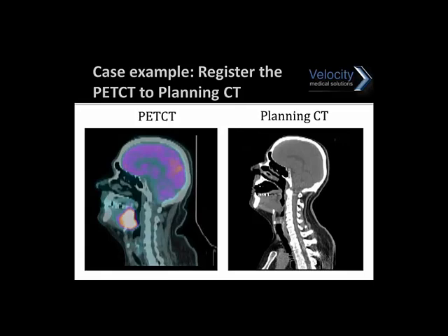And so if we go back to the displacement map, we can see the B-spline, it looks like the lower mandible came down and the upper mandible came up. So probably what you are going to get is a stretching of the teeth voxels across that space. And the Demons in this example is intensity-based, so it really wanted to match air to air.